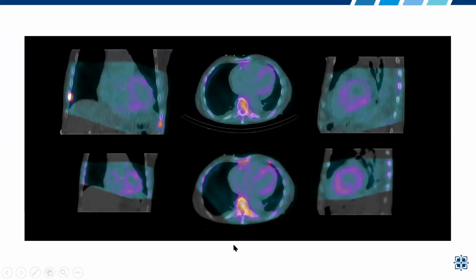So in situations where that occurs, the other problem that you can run into is if you make your regions of interest too small on either side, or you have to move it and it's in the diaphragm, or the liver or some other area instead of the contralateral lung, the problem is you're going to get a false ratio at either 1 or 3 hours. So in this situation, this is where the SPECT image becomes crucially important, so that you can see whether it truly is a positive study or not. Exactly.